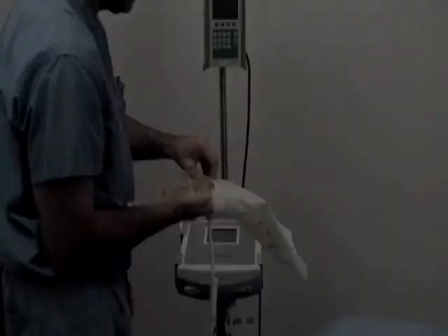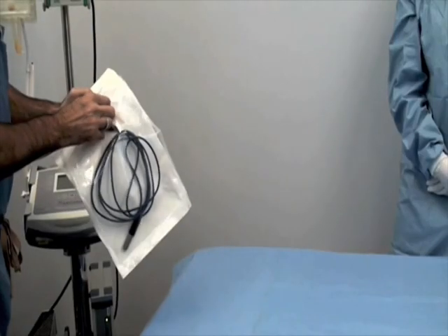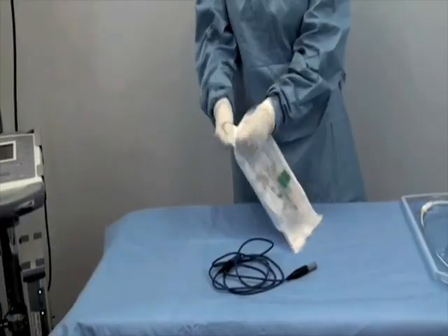Step 1. Flush. Turn the Impella console on. Place the D20 in the pressure bag. Open the Impella pump kit, including the blue cable and the quick setup kit, onto the sterile field.